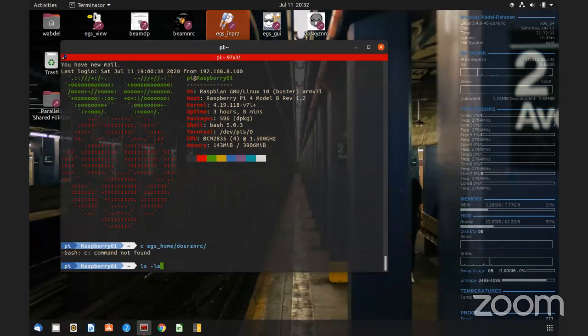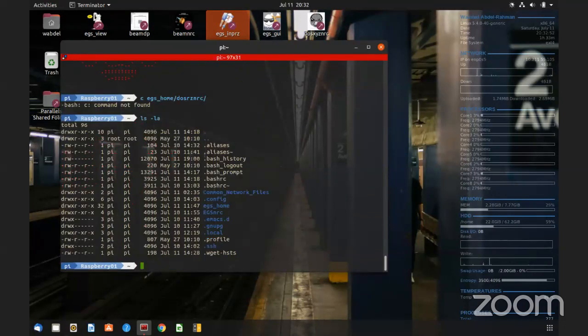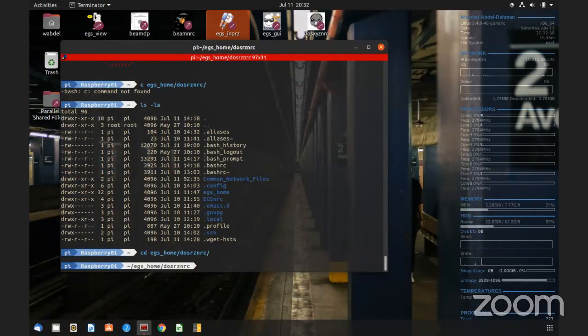Okay, so I ran with those XYZ, those RZ. There is this default template file that comes with it, and I made copies of these templates so that I can run exactly the same file on different machines, just so that I can do benchmarking.